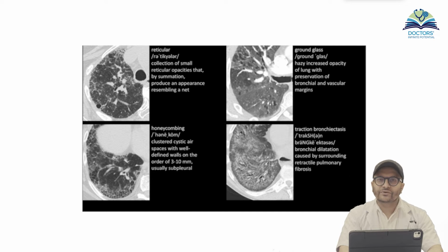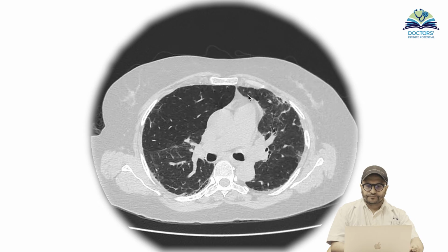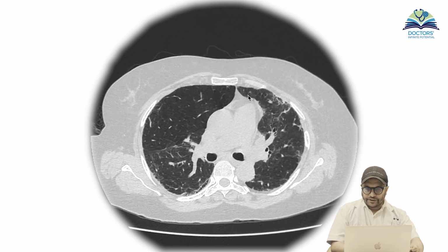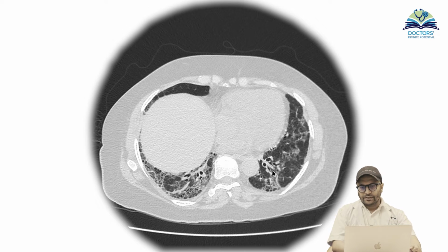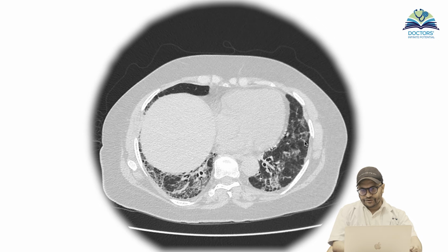Now you are ready to dive into the CT scan. This is the axial HRCT chest, which shows multiple reticulation in the bilateral lung fields, predominantly in the bilateral lower lobes. These are the reticulation, a linear lacy appearance of thickened interstitium.